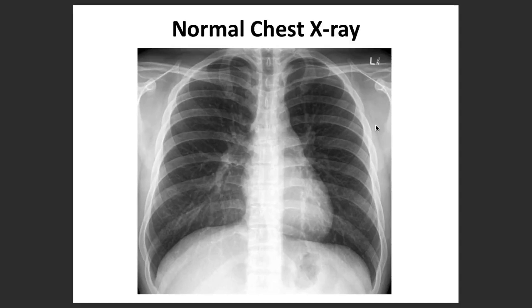So one of the important things which we all should know is, what does a normal chest X-ray look like? This is how a normal ideal chest X-ray looks. Initially, as I already said, the technical aspects you have to see are the patient's details, view, exposure, rotation, and the breath, which is inspiration or expiration. After you have commented on these, let's go deeper into the interpretation of chest X-rays.